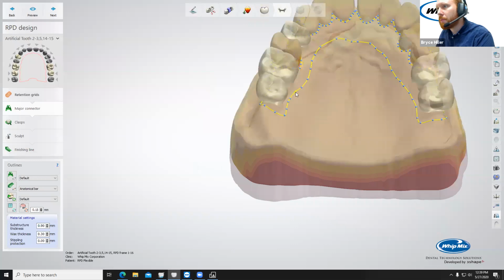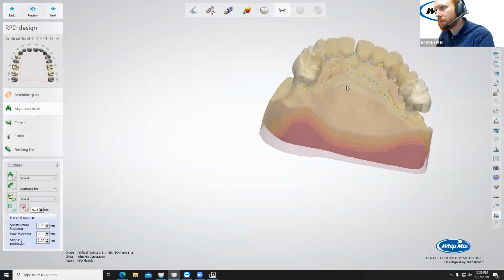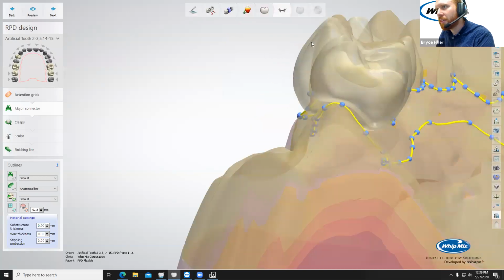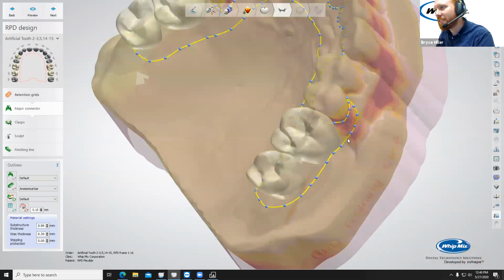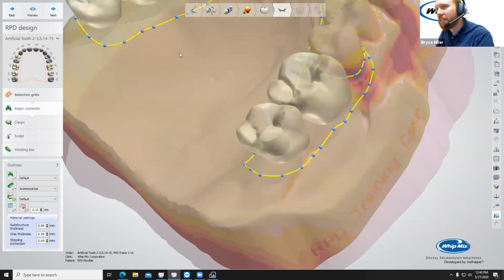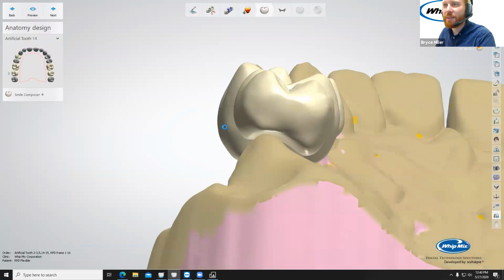All right. Move these down a little bit. Take a quick look around. This is gonna have to come down for sure. Oh my gosh, look at the belly. Look at that. I'm gonna be that guy. I'm sorry, I can't deal with it.